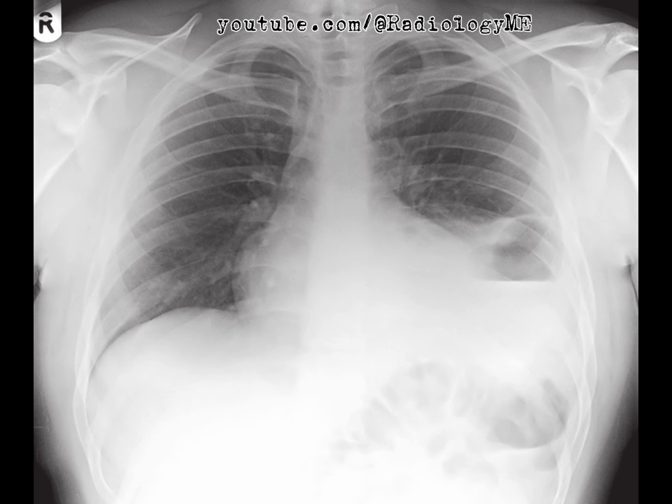Before we wrap this up, remember that this isn't just about catching an abnormality. It's about thinking ahead and recognizing how these findings tie into the patient's history and possible outcomes.